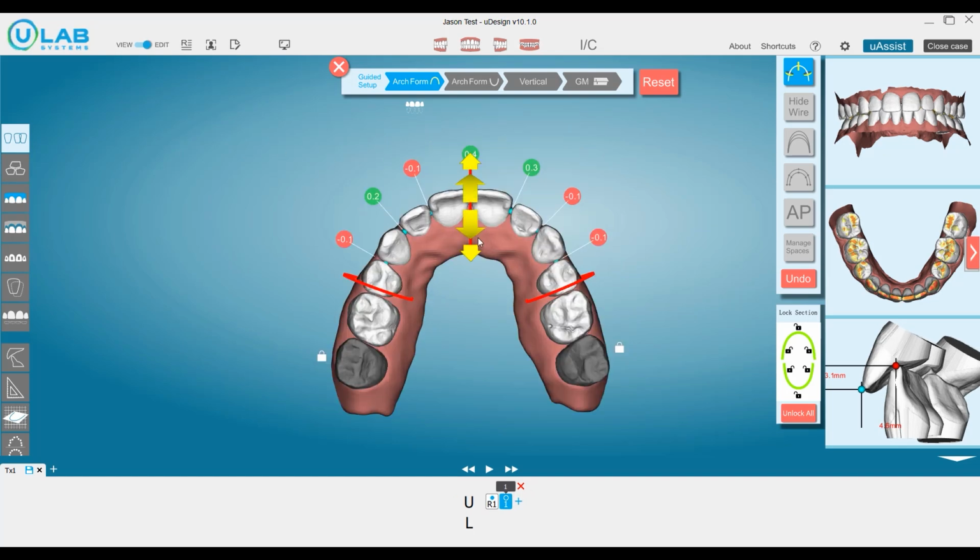As you retract the teeth, you will notice the white space numbers getting smaller. You may also notice some red numbers appear in other areas as well. Any red numbers indicate interproximal collision, or the areas are getting too tight and the teeth are starting to overlap. Keep retracting until you have approximately the same amount of positive and negative spaces.